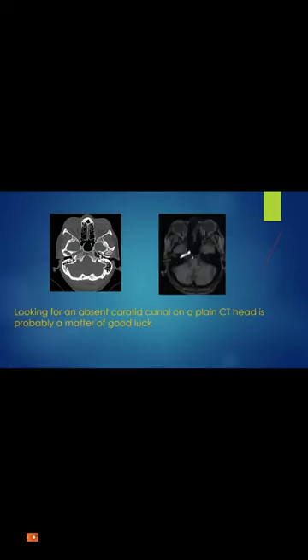So it is very easy to miss. This was like the fourth or fifth CT at our institution, and nobody detected that. I would miss it. Everybody can miss it. It was pure luck that I was able to see it.